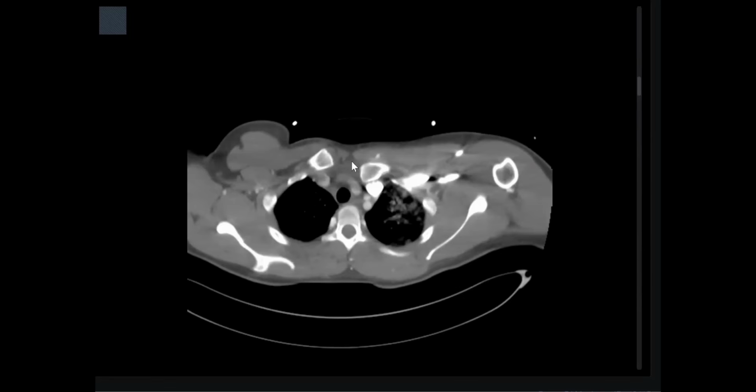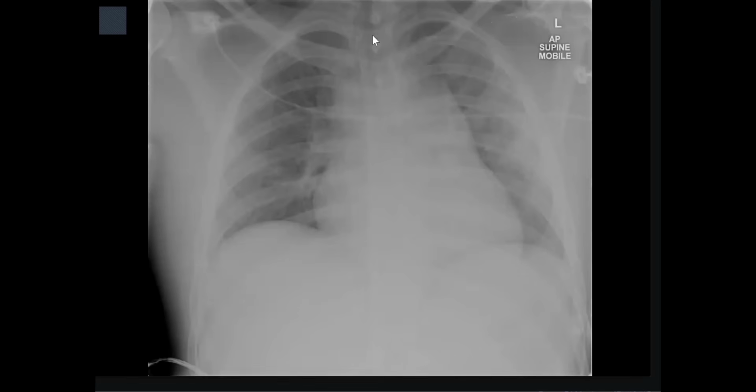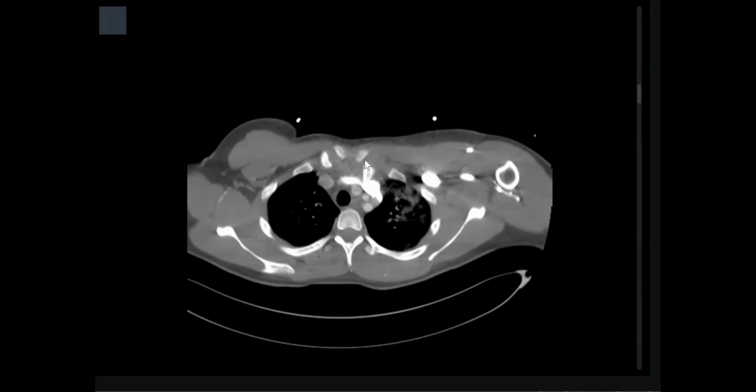Inshallah, sir, you will never miss it again. In X-ray, I told you I will see the sternum and this one, but coming here, I forgot. It's definitely missed here because it's at the same level. Don't rely on plain radiograph; CT is more perfect here.